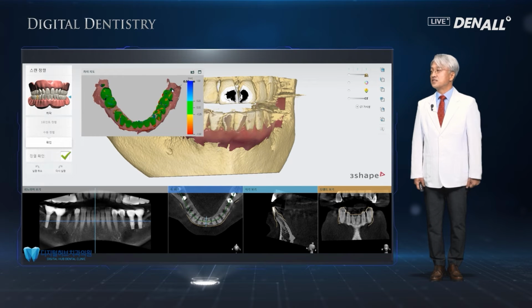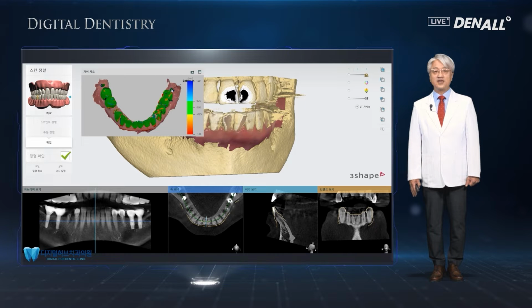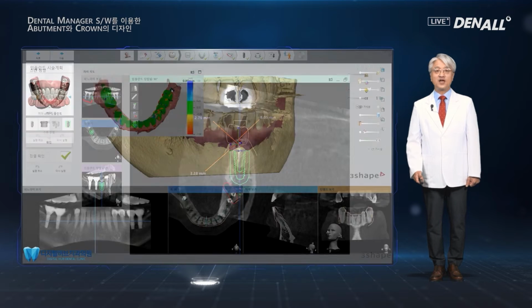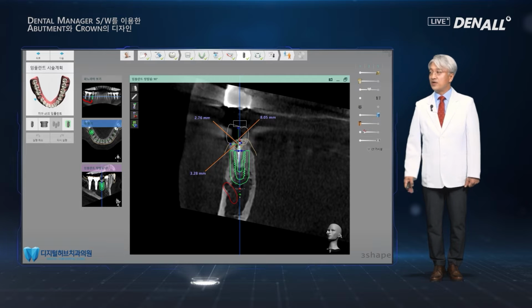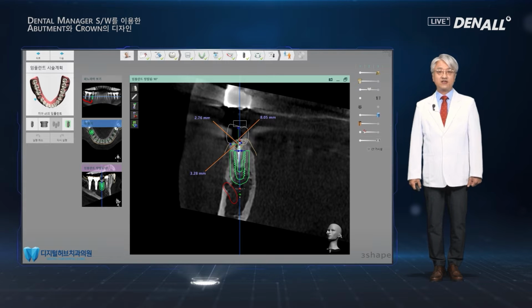As you can see, teeth as reference points are matched when you do the implant designing. In terms of accuracy and precision, the patient is reproduced on the computer for designing. As you can see, based on the pre-designed teeth, implant positions are designed precisely.